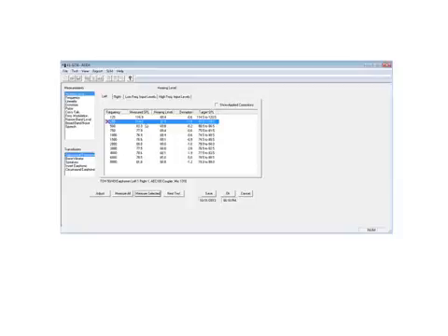measured sound pressure level. It turns out at 250 hertz that exceeds the target sound pressure level of 99.5, so audit software puts in a red X indicating that at this point the test has failed and you may need to retest or substitute a different earphone. Something in the system isn't working right.